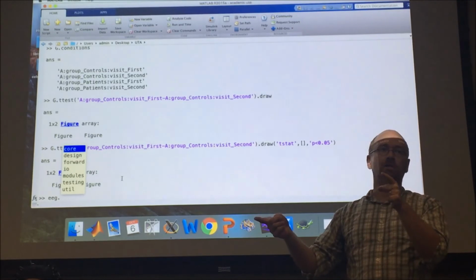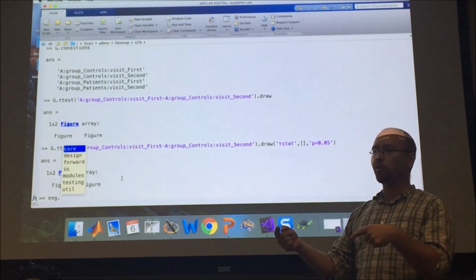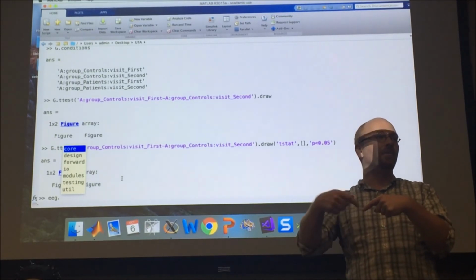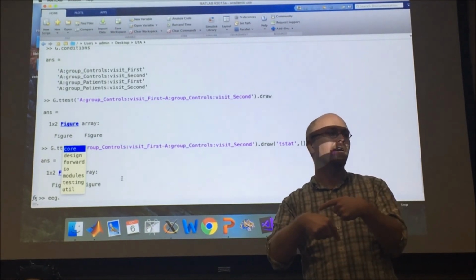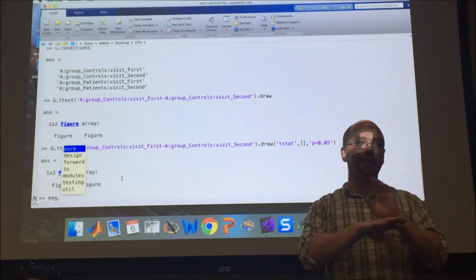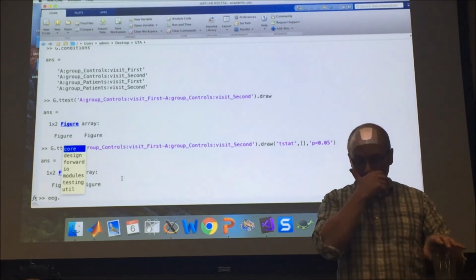And all of the modules and all of the commands and the draws and the stats and stuff are all interchangeable. So you can actually run all functions from my EEG toolbox on NIRS data, sometimes even if it doesn't make sense, because obviously running the Beer-Lambert on EEG doesn't make sense. But a lot of the tools use the exact same formats. So we've been expanding now in those contexts.